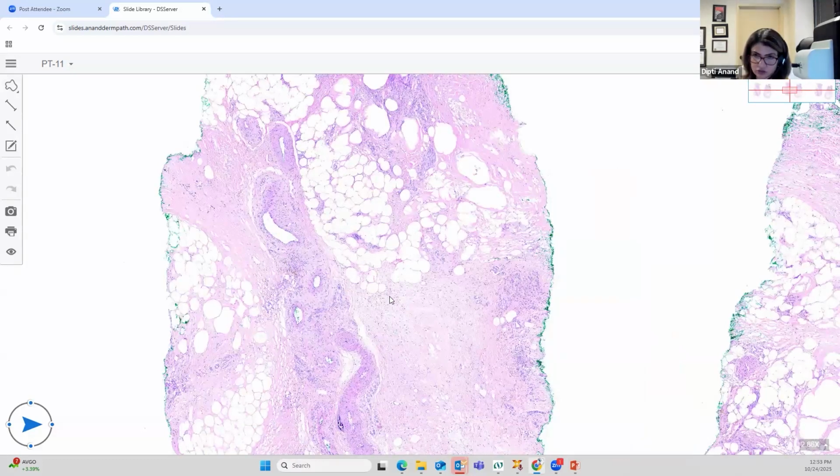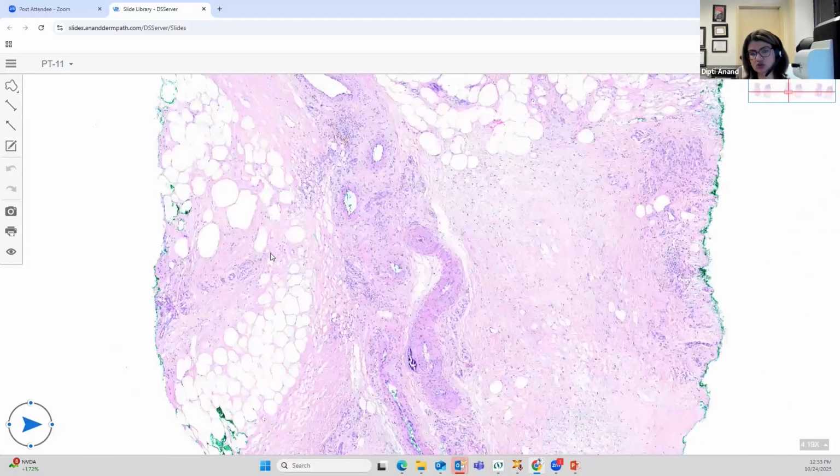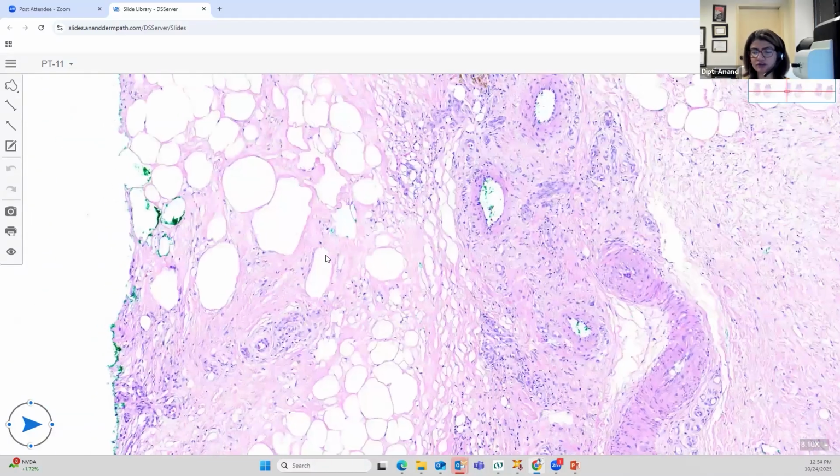Now, lipodermatosclerosis, similar to lupus profundus, is a clean pink fat necrosis. So you see this very pink necrotic fat, which is not dirty. You do not see neutrophils. You do not see much inflammation at all. So unlike lupus profundus, which is very inflamed, which has so many lymphocytes, this is pauci-inflammatory. You don't see many lymphocytes at all. You definitely don't see any neutrophils.